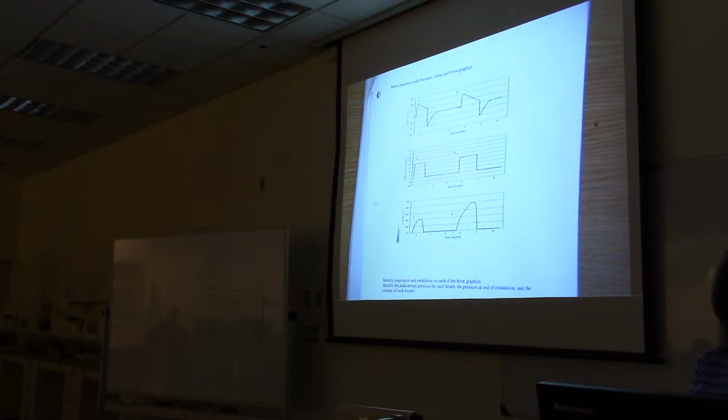Identify inspiration and exhalation on each of the 3 graphics.